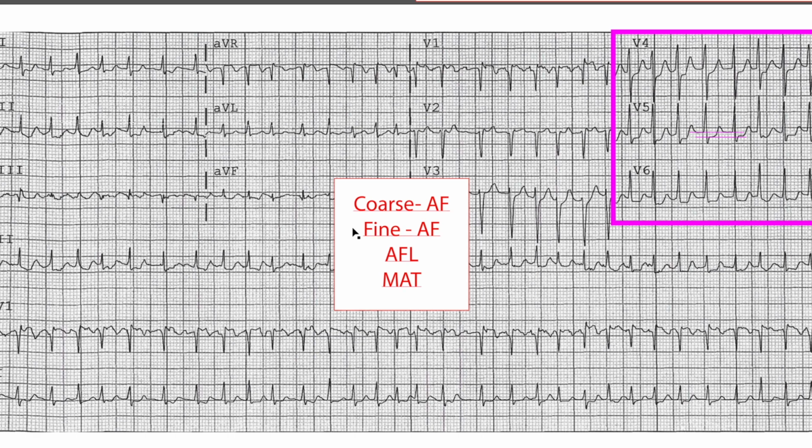Absolutely not. Maybe later down the line to an electrophysiologist or a cardiologist perhaps, but just for the sake of labeling this rhythm and passing it on or inputting this information into your diagnostic chart, if you were to call this atrial fibrillation, that would be just fine.